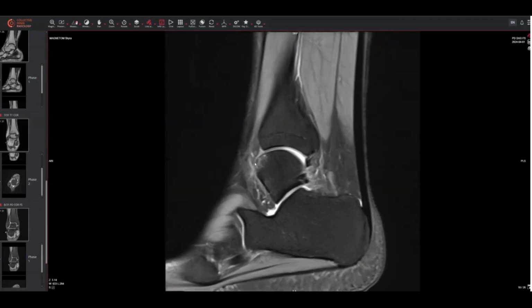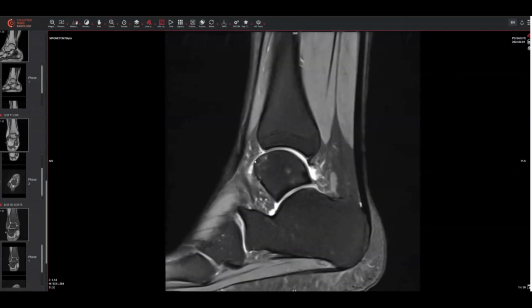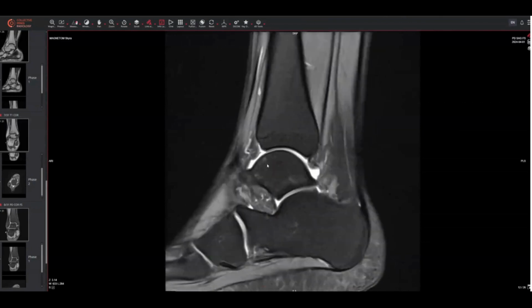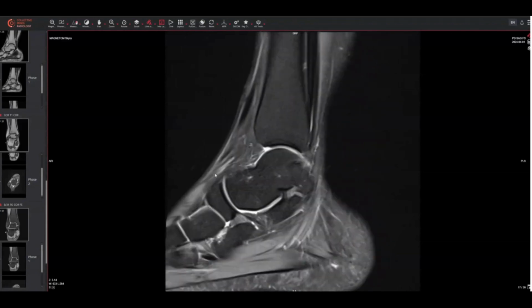what we can appreciate is that we have this anterolateral talar dome osteochondral contusion with no fluid undermining the fragment or bed. We have some chondral thinning along the dorsal aspect. I would say that this is a grade 1 osteochondral contusion at the anterolateral dome. I can also see some patchy cystic change, perhaps some mild edema where the dorsal talonavicular ligament attaches.